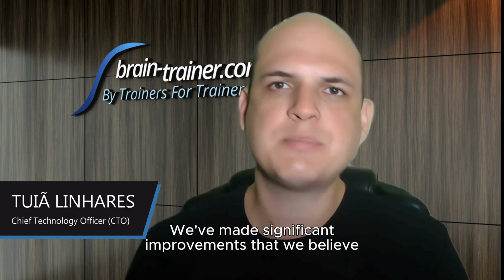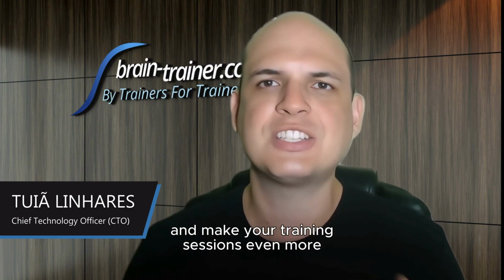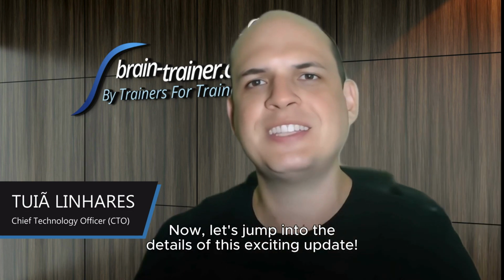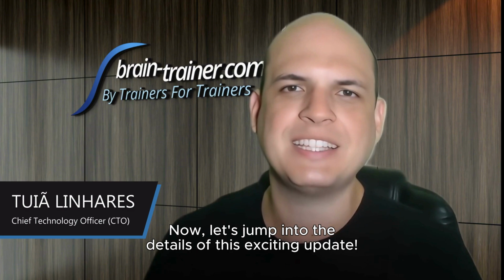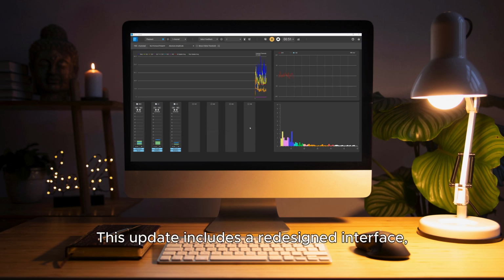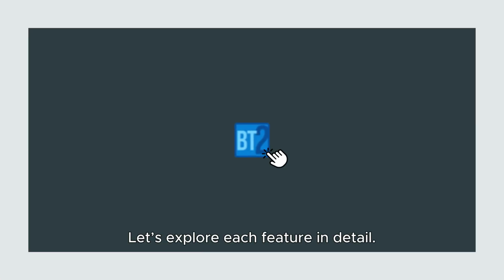We've made significant improvements that we believe will enhance your experience and make your training sessions even more effective and enjoyable. Now let's jump into the details of this exciting update. Let me walk you through the key improvements in Brain Trainer version 2.25. This update includes a redesigned interface, enhanced tools for training, and new customization options to make your experience even better. Let's explore each feature in detail.